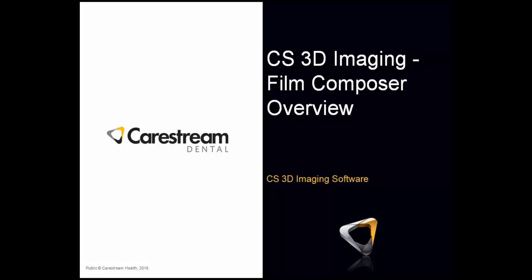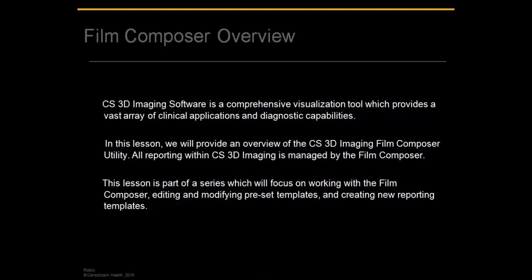In this lesson, we will provide an overview of the CS3D Imaging Film Composer utility. All reporting within CS3D Imaging is managed by the Film Composer. This lesson is part of a series. The series will cover working with the Film Composer, editing and modifying preset templates, and creating new templates.